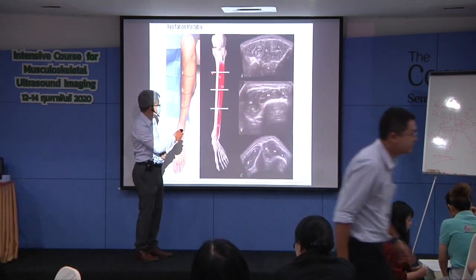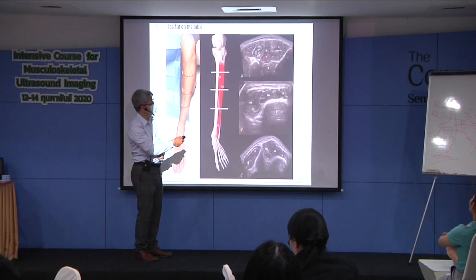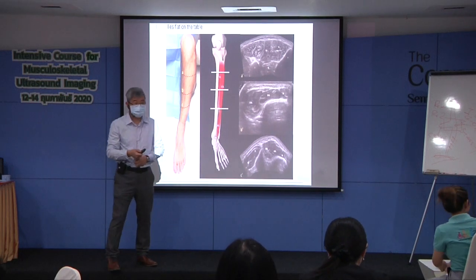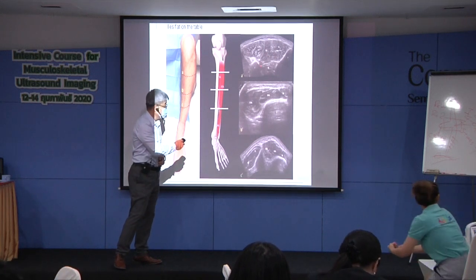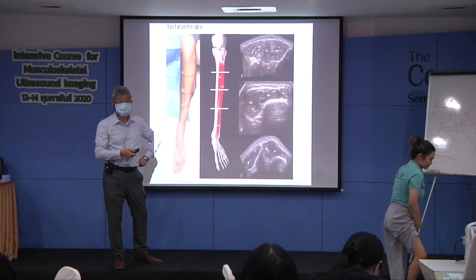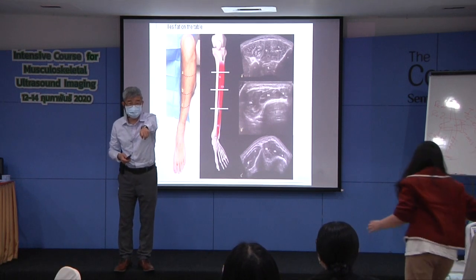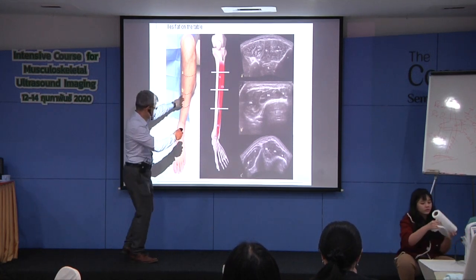So remember, in the upper third, two muscles and the two muscles only. In here, it's probably just a little head of the extensor hallucis longus. But for some people, the head of the extensor hallucis longus cannot be observed completely at this level. But some people can. Your tibialis anterior, the head of the extensor hallucis longus can be observed at this level.